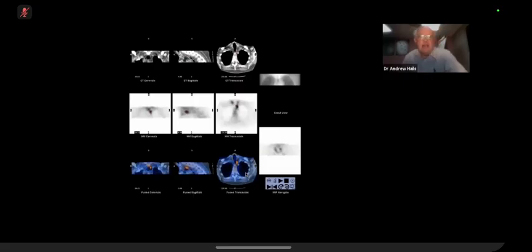At least in theory, they then don't have to explore both sides of the neck, and they can hone in much better for where the parathyroid gland is. And this is an image, I must admit, from Google. It just shows that there's an ectopic parathyroid adenoma on this SESTAMIBI image. And SESTAMIBI has gone to the heart.